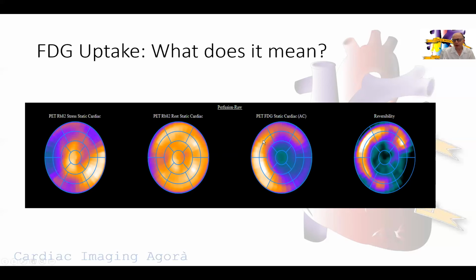And therefore, when we went back to do the FDG images, we still were able to pick that area where the myocardial metabolism has shifted from fatty acid to glucose. Or the patient came to our lab with repetitive areas of ischemia, walking around, probably basically doing his own stress test on a daily basis.